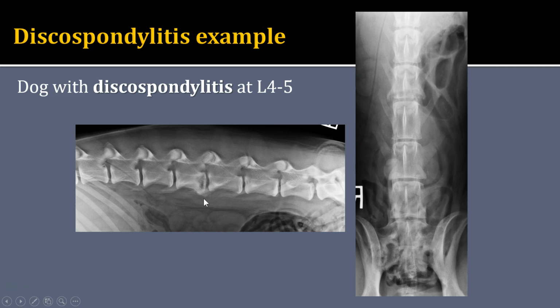I think that this is one time that you might get by with just doing lateral radiographs and not getting your orthogonal views. I forgot to point out on the orthogonal view of this patient, I can see that lysis at the caudal end plate, but again, some of the gas in the intestinal tract may kind of get in our way.